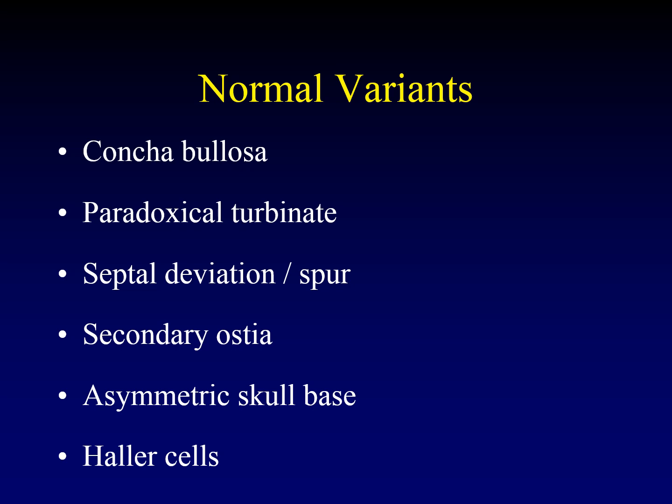When we're imaging the paranasal sinuses, we spend a lot of time looking for normal anatomic variants. If these are normal variants and they don't have clinical implications, why do we spend so much time on them? Because they can affect the endoscopic approach and can get in the way of endoscopic evaluation.